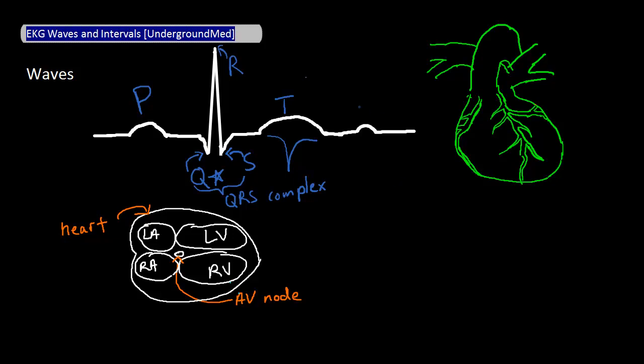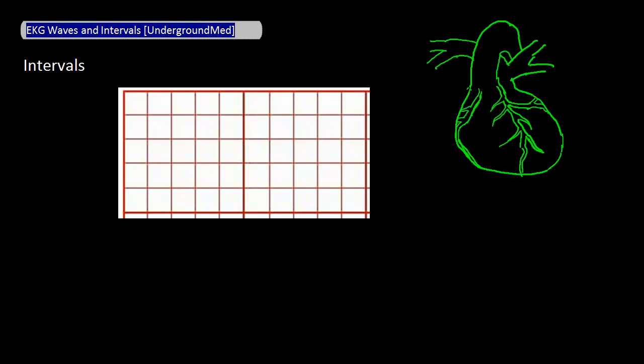The last wave is called the U wave. It is generally not present, but can be present in bradycardia, hypokalemia, hypothermia, and a few other situations. We won't concern ourselves with U waves in these videos because they are uncommon. So that's it. Those 6 waves are repeated over and over to make up an EKG. If you can recognize those waves, you can turn what at first appears to be a page full of squiggly lines into something with meaning.